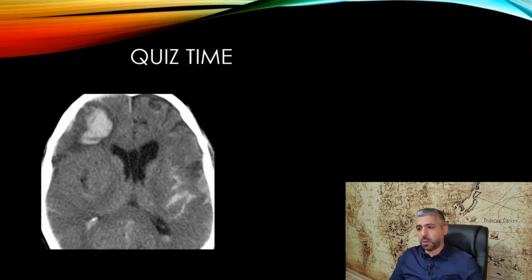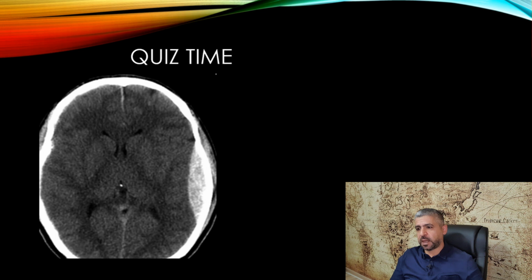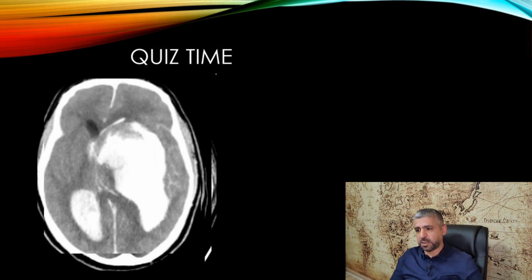This is the first one. What kind of hematoma is that? Or what kind of intracranial hemorrhage is that? Second one, what kind of intracranial hemorrhage is that? Third, fourth, and the last example or the last question is this. What kind of intracranial hemorrhage is that?